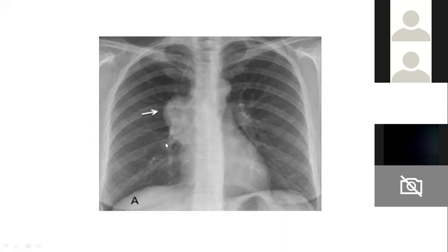These are just examples. I will not give you the final diagnosis here. We will again discuss it in the next class, when we do a case discussion on these. Definitely, it's a mediastinal mass. Now I can say this, right?